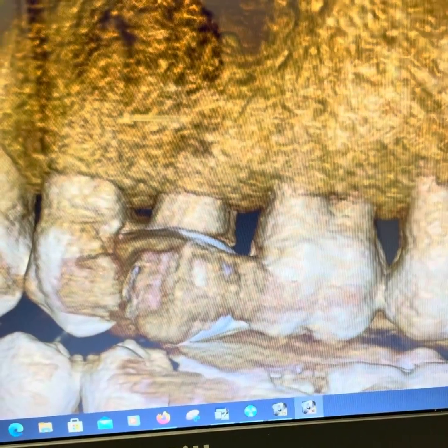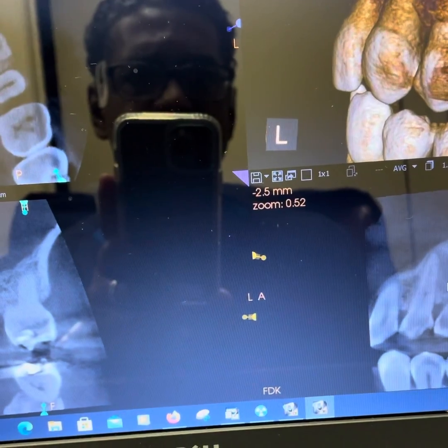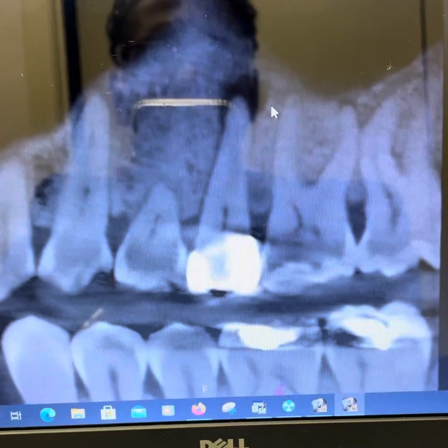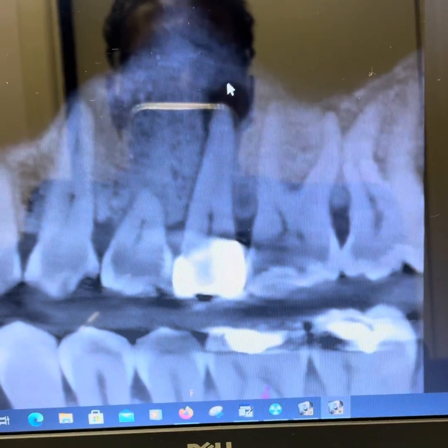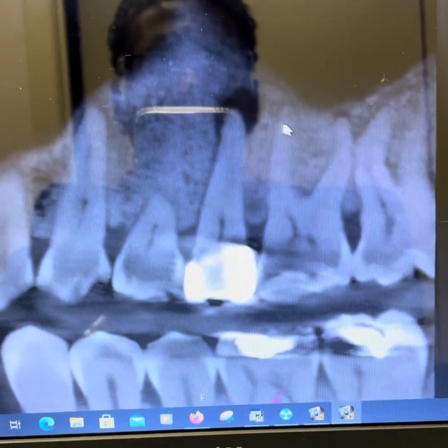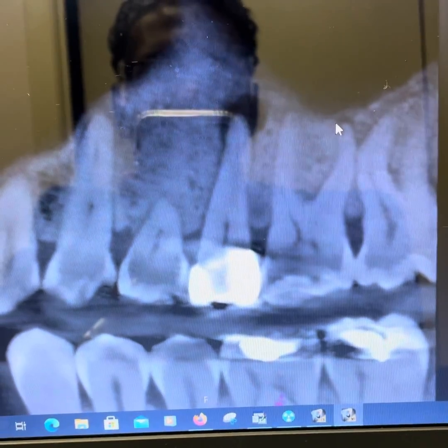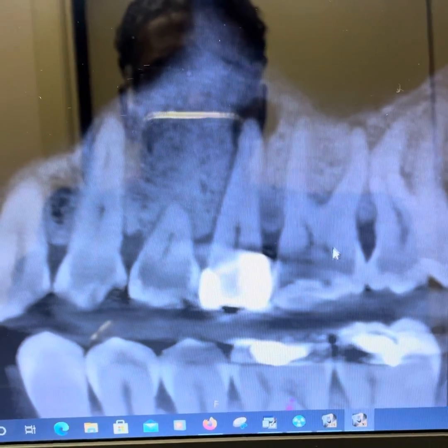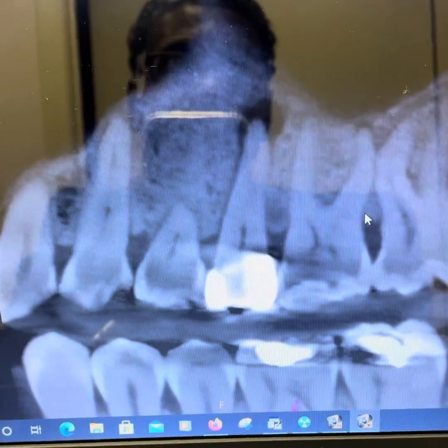However, once we decided to do a sagittal slice here, we can see from the sagittal slice a large area here, and we also can see an area on that distal buccal root of tooth number 14. So this pulp actually was a partial necrotic pulp.